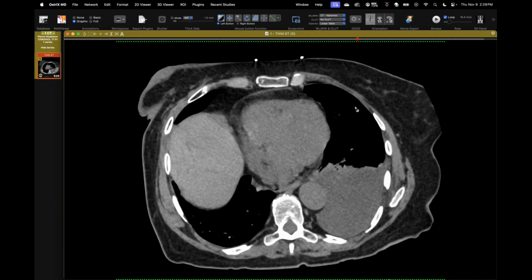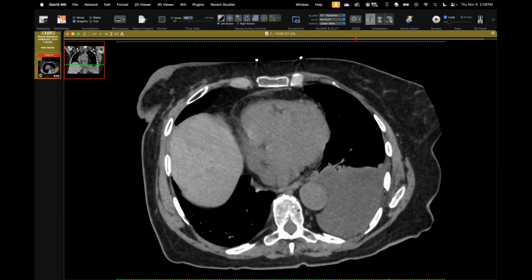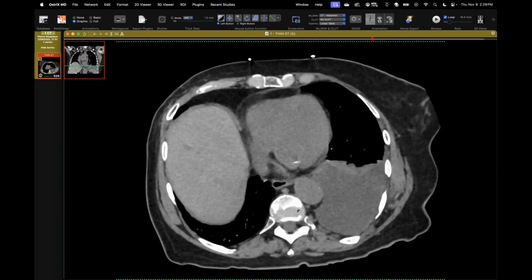But this was an odd one. We're not seeing as many mesotheliomas anymore, but I only remember maybe one or two that presented more as just a loculated effusion like this. David, Howard, you've probably seen more than I have. Do you recall ever seeing ones that don't have the typical rind? I've had a couple as a mass, but not just as a loculated effusion.